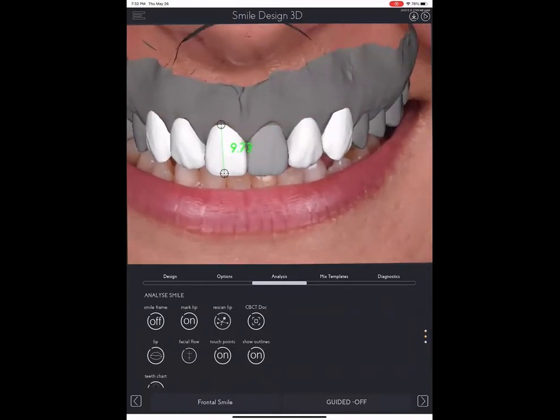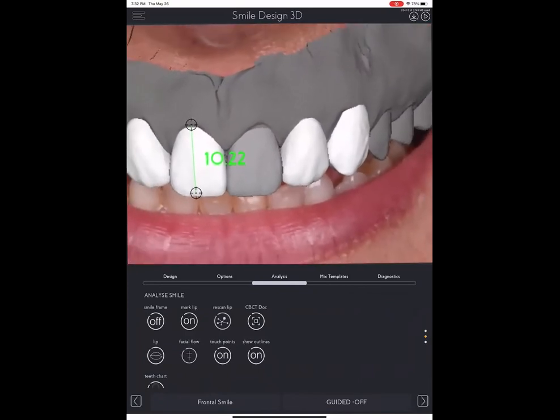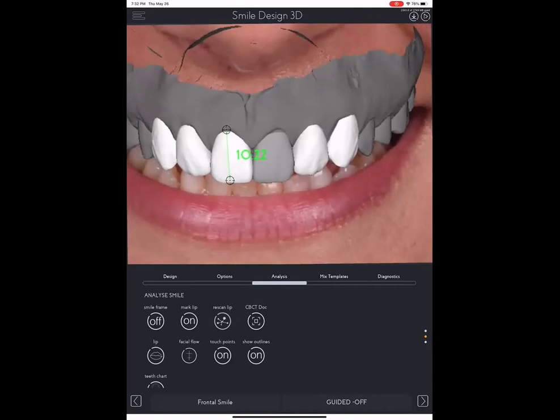Okay. Let me expose the intraoral scan a little bit more. These little details that you guys are seeing here, let's say close here to the margin, right here, that's something that we can do a quick fix in the mesh editor version, which is the last version. It's when you literally do the digital waxing. But right now, I'm seeing here a 10.85, which is great.